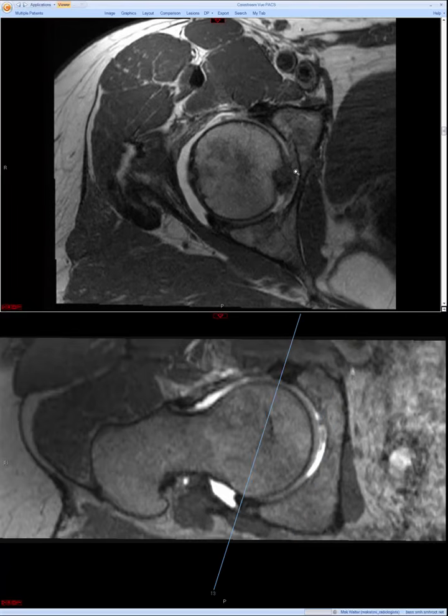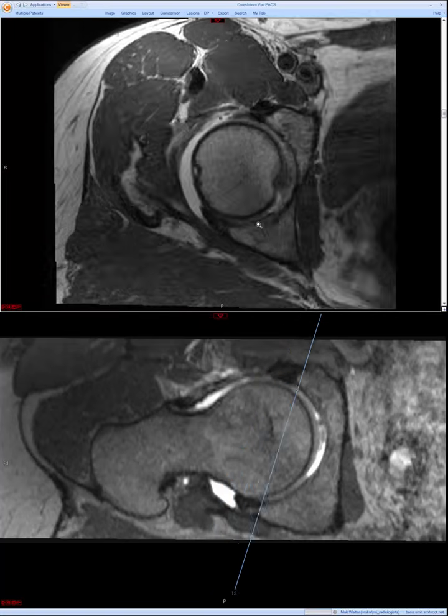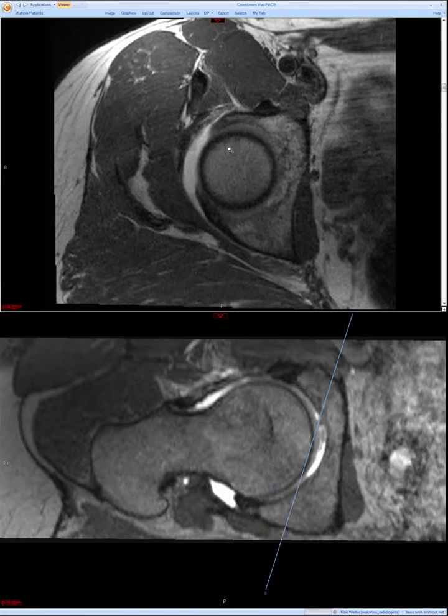If you only look down at the equatorial level or below, the anterior wall of the acetabulum, I can assure you, will always be medial to the posterior wall, and everyone is normally anteverted at this point. So to pick up this retroversion of the acetabulum, you really have to look up high.